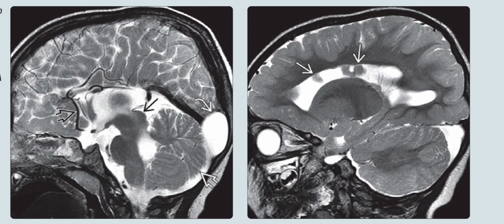A retrocerebellar cyst with elevation of the torcular is also noted. The vermis and tectum appear dysplastic. Right is the more lateral T2 fat-suppressed MRI sequence in the same patient, and it shows multiple nodules of heterotopic gray matter, which are seen protruding into the lateral ventricle.